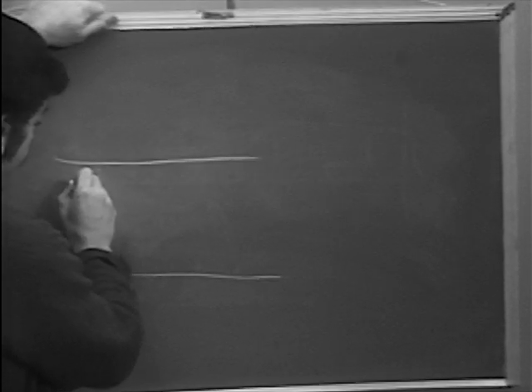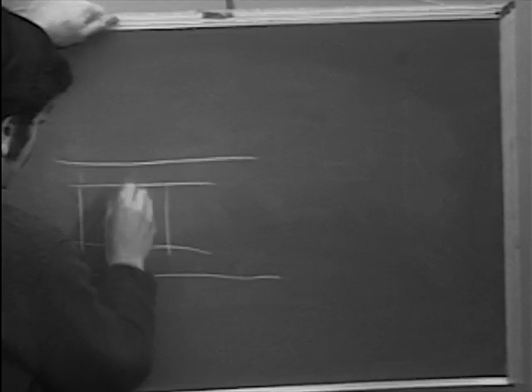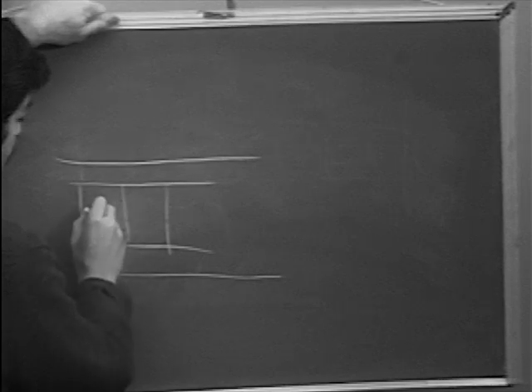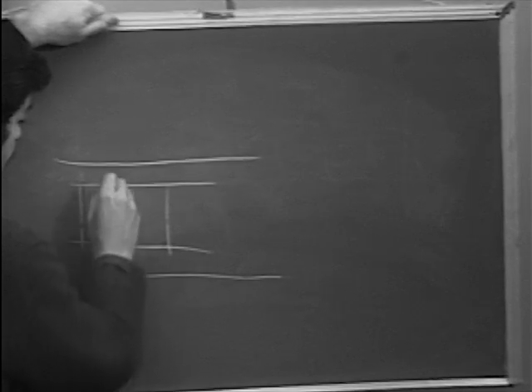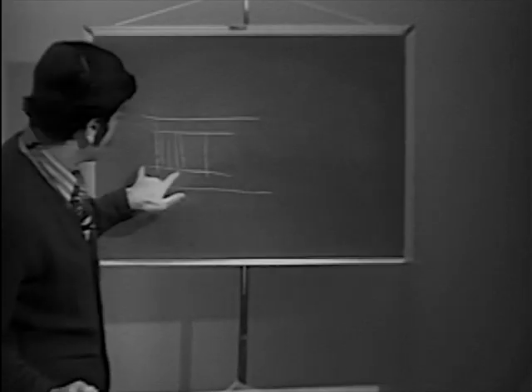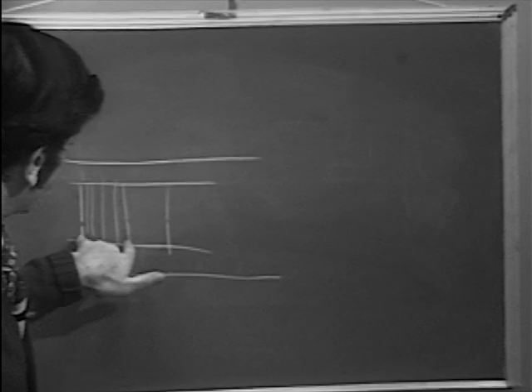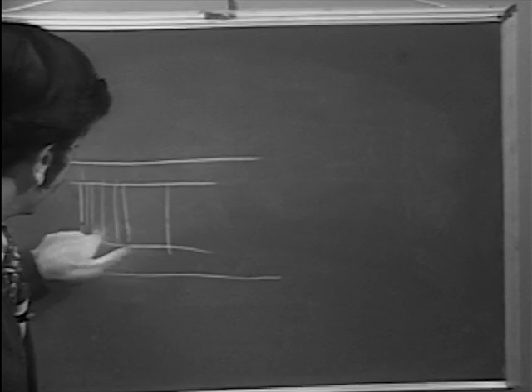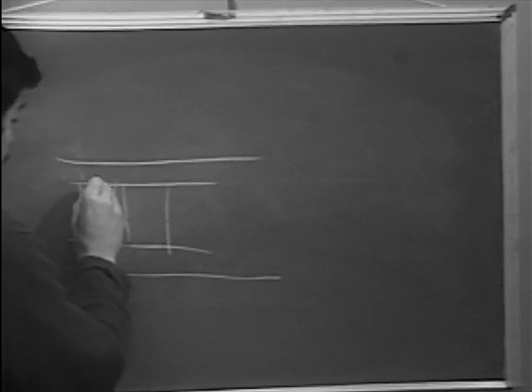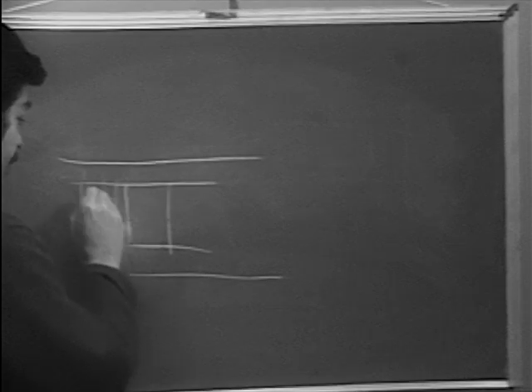And we have these vertical lines occurring, which are divided by 5 very small boxes. So you have boxes with dark lines in which there are boxes with lighter lines, and there are 5 of those within each one of these boxes.